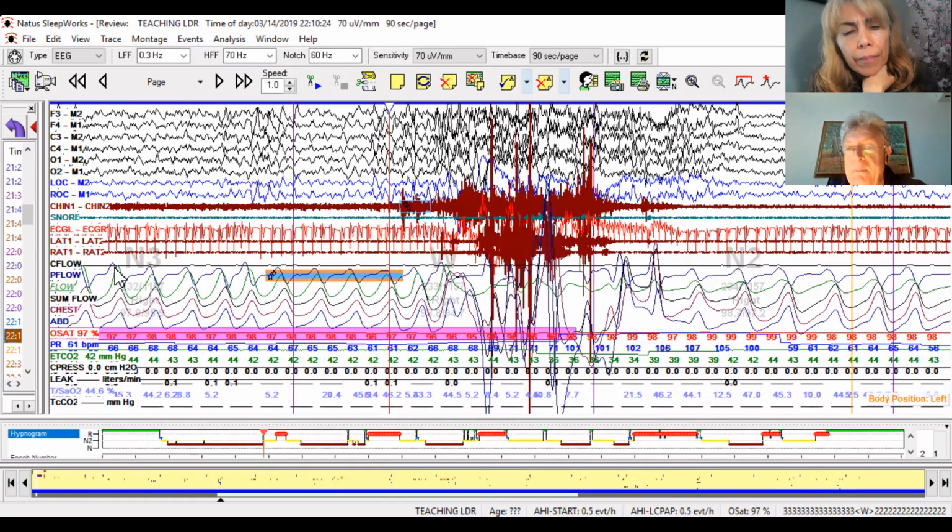It occurs during sleep, but that epoch has been scored as wakeful. So this movement is counted, but is assigned to the N3 stage, the epoch that precedes the epoch that has been scored.